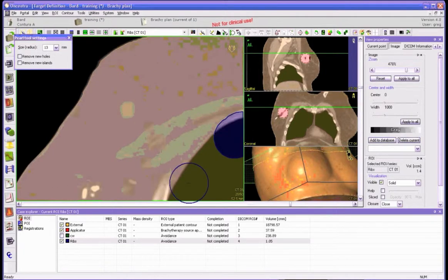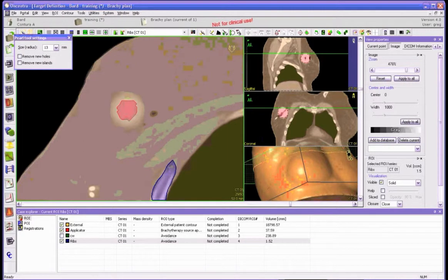But there we go. Now if we try to draw a second rib in the same view, we have to hold down the space bar to make it in draw mode, because it'll by default be trying to erase. And then I'll erase the excess for both of these. This one I also need to draw a little more.